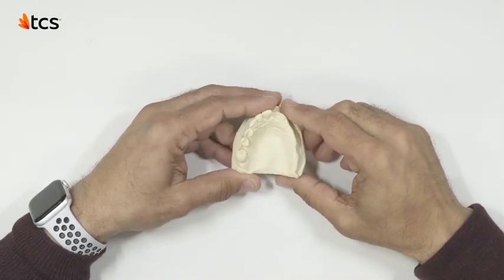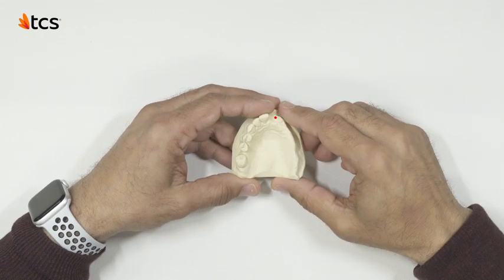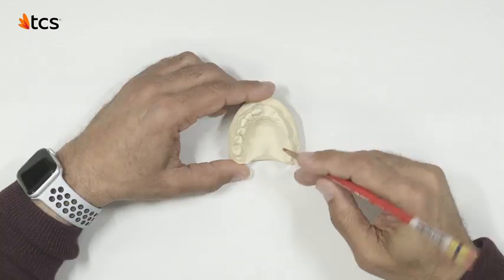The main concern with this case is the length of this distal extension with lack of abutments. When injecting TCS resins, there is a shrinkage phase that occurs once the melting process has cooled. This can in fact alter the fit of the partial if design is not executed with this in mind.